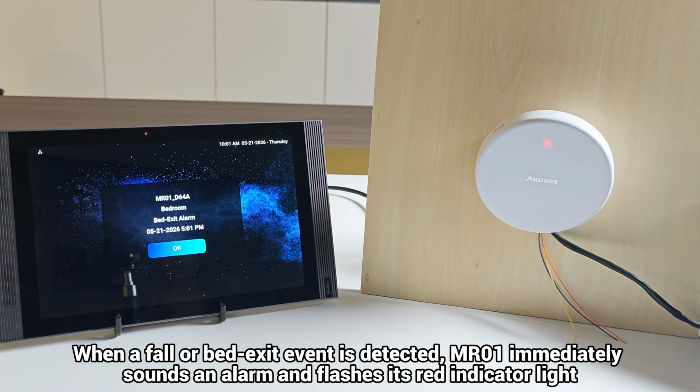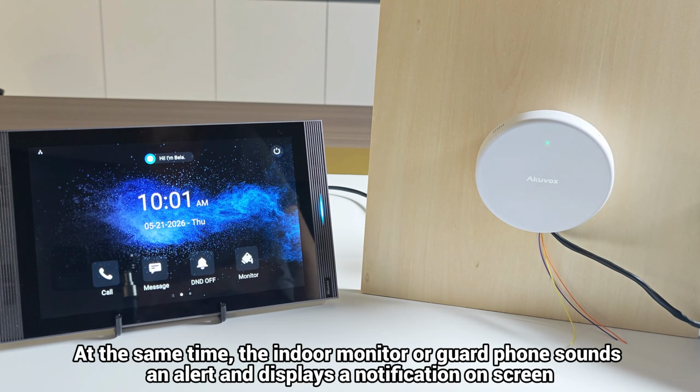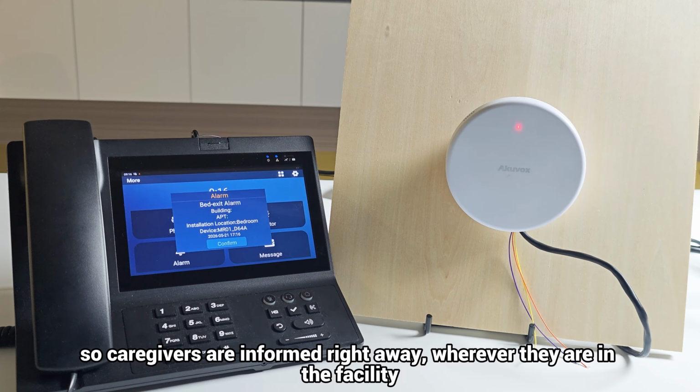With everything configured, let's see the full workflow in action. When a fall or bed exit event is detected, MR01 immediately sounds an alarm and flashes its red indicator light, providing a clear on-device signal. At the same time, the indoor monitor or guard phone sounds an alert and displays a notification on screen, so caregivers are informed right away, wherever they are in the facility.